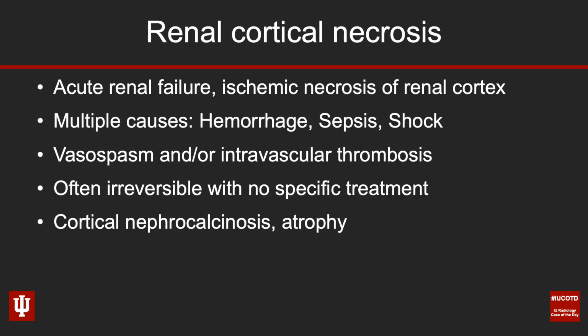This is a case of renal cortical necrosis, which is a form of acute renal failure from severe hemodynamic compromise and derangement of flow to the kidneys. This causes ischemic necrosis of the renal cortex while sparing the medulla.